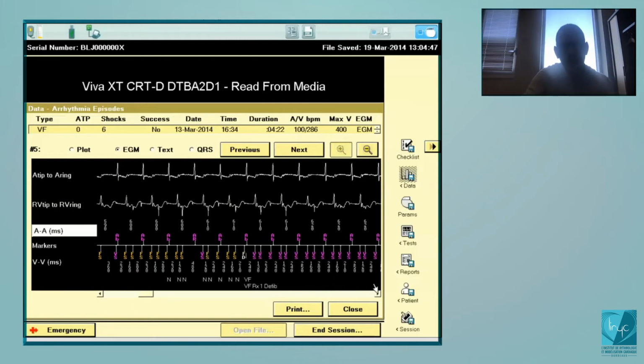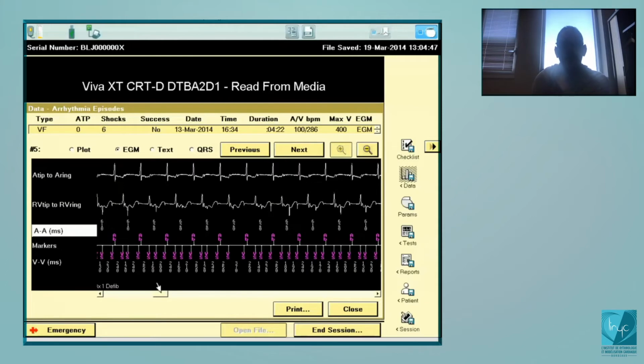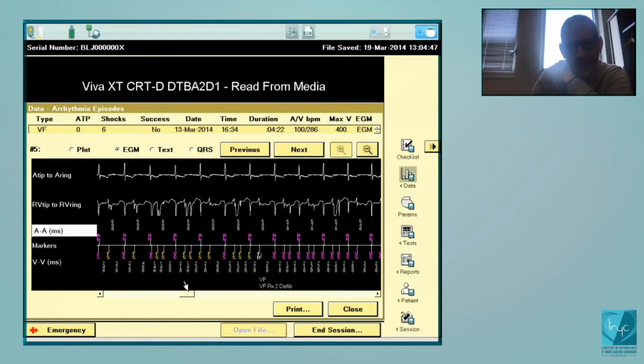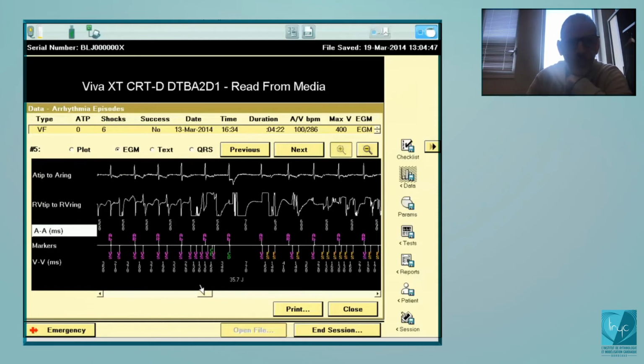But you see here the situation, you see the signals, and that's something I hope we should avoid now, this problem of repetitive inappropriate therapy. Here it's quite obvious. You see unphysiological signals. You see these signals have been clipped because of high amplitude. That's a problem of probably lead dysfunction, no doubt about it.